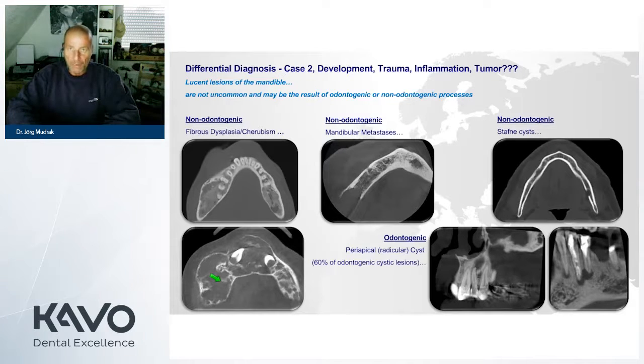Maybe also think about the radiologic box we were dropping in, because in this case it's not that easy. I can see that there is quite a unique opinion. Now it's getting a little bit more variation. All the differential diagnoses are not just originating from my fantasy. They are really related to the case, and it might be any of them. Please keep that in mind.